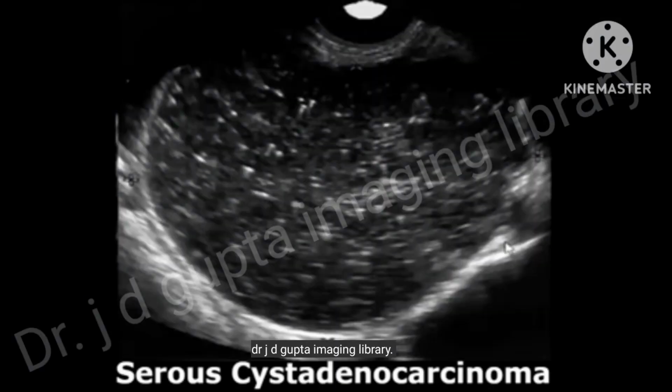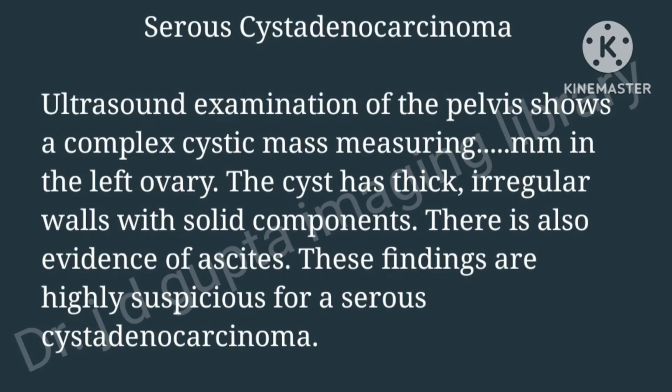Next one talks about serous cystadenocarcinoma. Ultrasound examination of the pelvis shows a complex cystic mass in the left ovary. The cyst has thick, irregular walls with solid components. There is also evidence of ascites. These findings are highly suspicious for a serous cystadenocarcinoma.